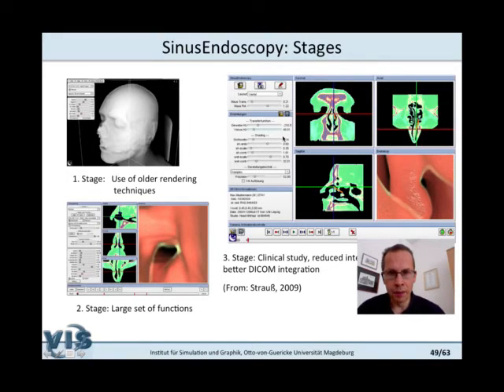We reduced the interface options here from 12 to 6. Two of these factors relate to these wetness effects. How far we could look into the structures could be adjusted. So these are examples for the things that could be specified as input for the computation of a video sequence that could then be looked at with a classic functionality of a video recorder. You can play, you can go forward and backward and stop and so on.